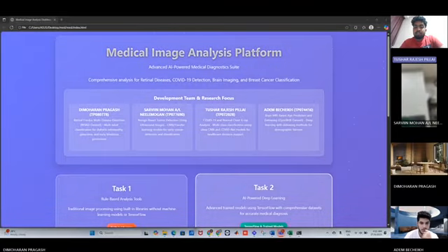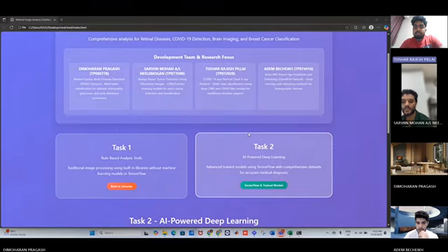So, the GUI and interface. To make this project more usable, we developed a GUI so end users can upload a chest X-ray image and get a prediction, COVID versus normal. The GUI also displays sample output, that is, the prediction probability, and optionally pre and post processing steps. For example, showing the image after normalization, maybe overlaying a heat map or explaining the output. This helps make the system more accessible for demonstration or for non-technical users as well.